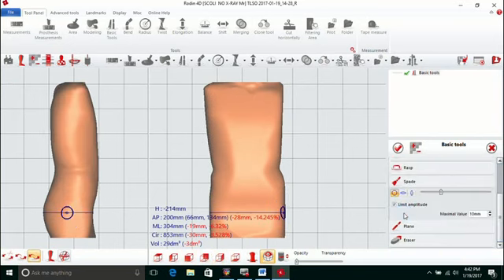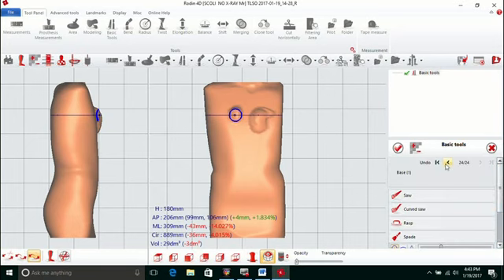Alright, moving down. The Spade. That's like adding plaster. And I'll show you on the screen. Left click, hold down. This will keep building and building. If I select limit amplitude, right now it's set for 10 millimeters. So that means if I hold down the mouse here all day long, it's only going to be restricted to building 10 millimeters. If I uncheck that, that will just keep building and building the longer I hold that mouse. Now I'll back up and undo that.